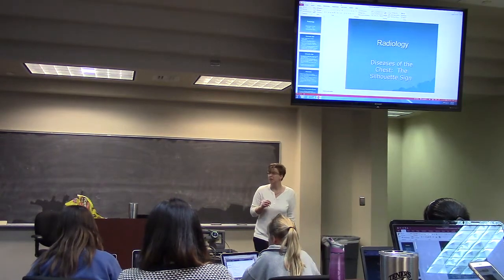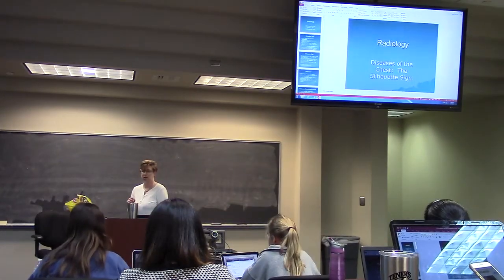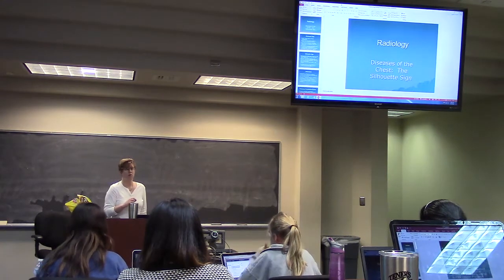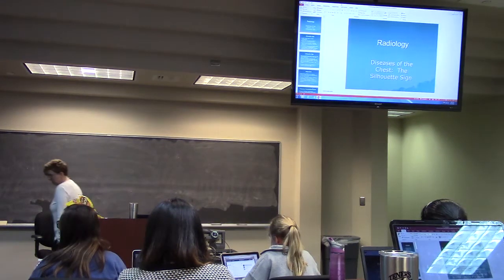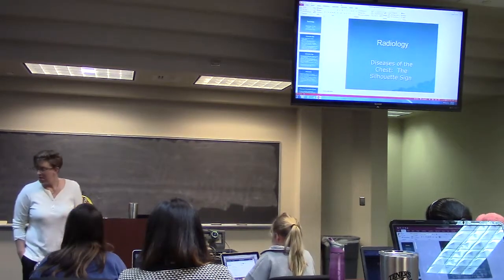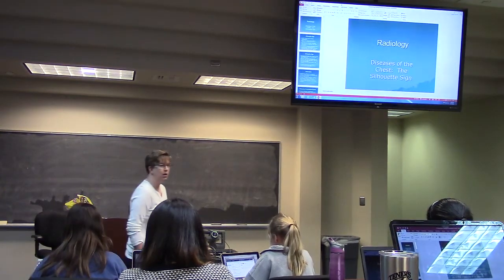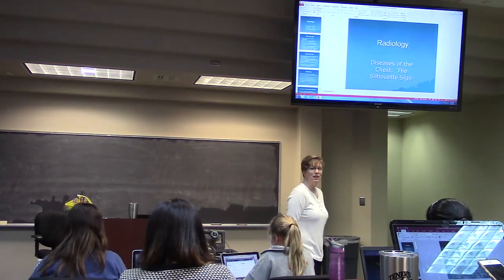So those very specific areas that we're going to look at: the left heart margin equals the lingula.